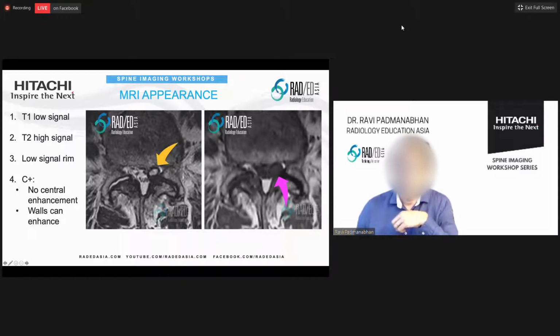So what you're looking for is usually a pretty well marginated cyst. So it's got this low signal rim. This is a T2 weighted sequence, so the cyst is bright. This is T1, cyst is low signal. And this is a very typical appearance of a facet cyst.